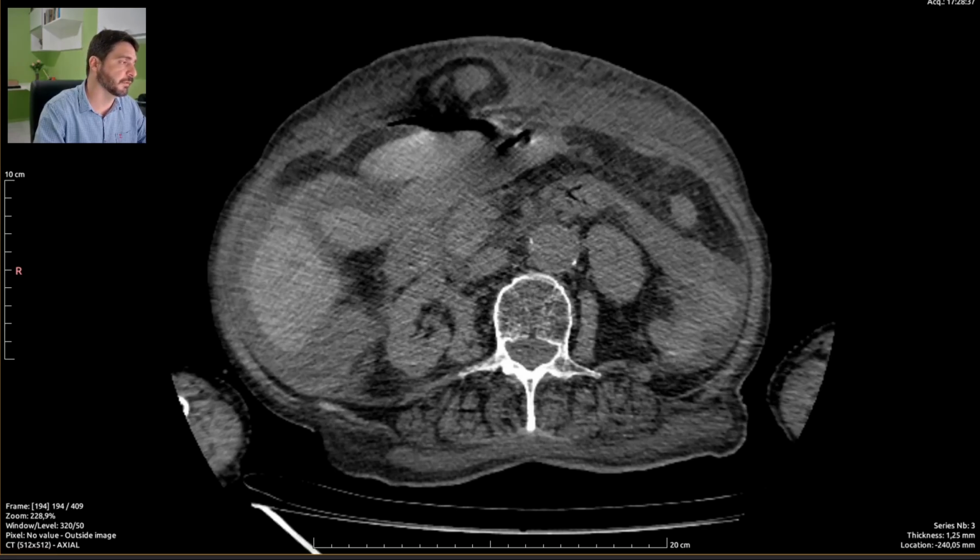Lots of edema everywhere. In Portuguese we call it anasarca. I really don't know the terminology in English. Maybe it's just diffuse edema. It's much simpler. I guess anasarca comes from the Latin terminology, which isn't so popular in the United States or any other English-speaking country. We just like it in Brazil.